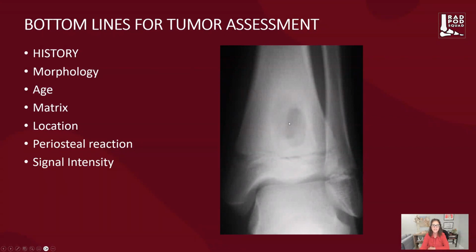As we can see here, we have this lesion. It is geographic, and we can see this lucent lesion in the metaphyseal region. Notice also that there's some kind of poor definition around it. This patient turned out to have a Brodie's abscess. This is actually an infection with a type of patchy, ill-defined border around it. So very common, Brodie's subacute osteomyelitis and Brodie's abscess.